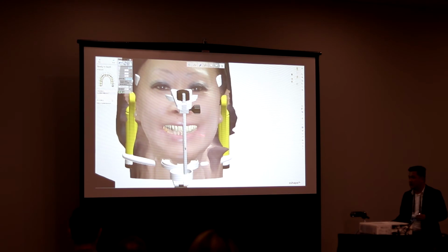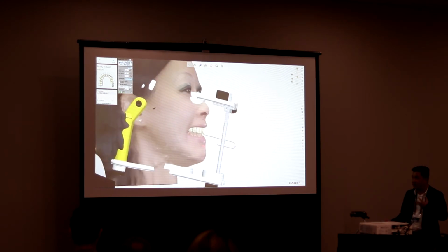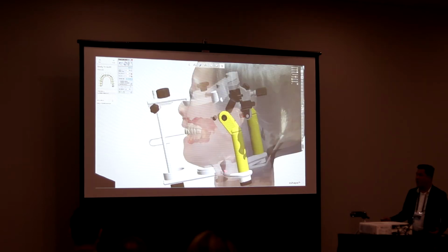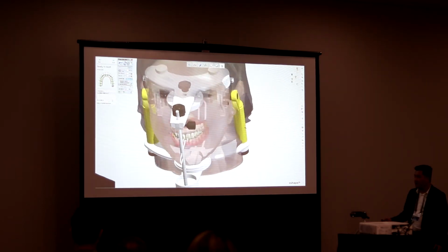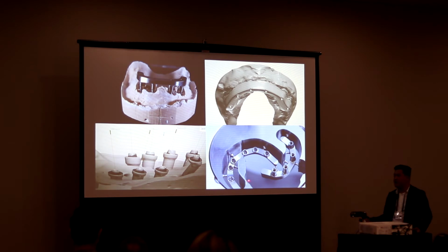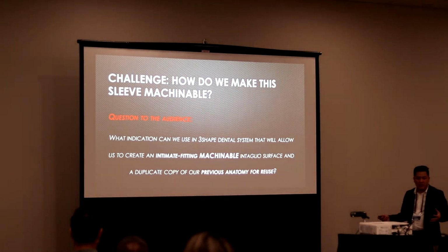We punch some holes, and he can realign it in the mouth with some temp cylinders. And you can use this for the patient long term while we're dialing the bite and doing the final definitive. Meanwhile, I mill a bar once we verify everything. So we do a titanium bar, mill this out, and we're going to make a little zirconia sleeve over top of this. So once again, do I go through and try like a barbarian and start from scratch? Of course not. But I take my initial design. If there was any kind of modification, then we'll do it then.